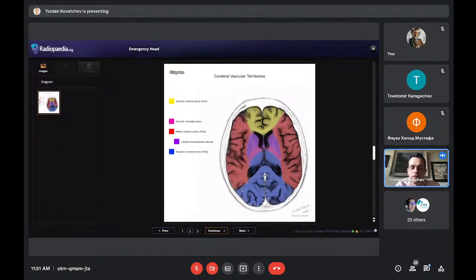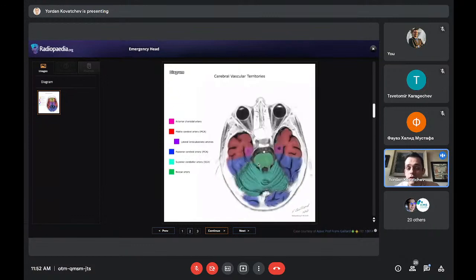That's how we initially think that maybe there is infarction there. Because if something is affecting the whole area here, either that's a watershed infarct, which is more rare and usually attributed to some pathology of the carotid artery, or more often there is a mass, there's something else going on, but it's not an infarct. When you see changes that are clearly demarcated in these vascular areas, it's a clear indication that there is a vascular problem.